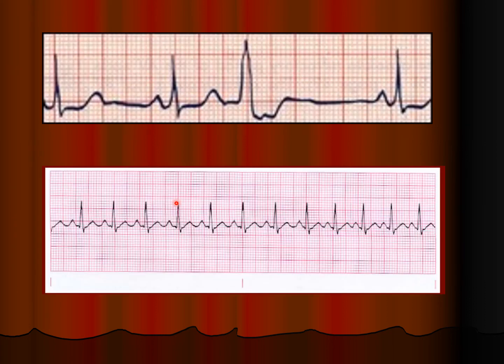Now we're looking at our P wave, QRS, T, and whoa, what the heck is that? Remember, wide and bizarre, junk in the trunk. This is a PVC. Premature, it came early because we were expecting it to come somewhere over here, and it didn't. It came early, so it's premature. We got some junk in the trunk, and it's wide and bizarre. It doesn't look like anything we expect. That's a premature ventricular contraction.